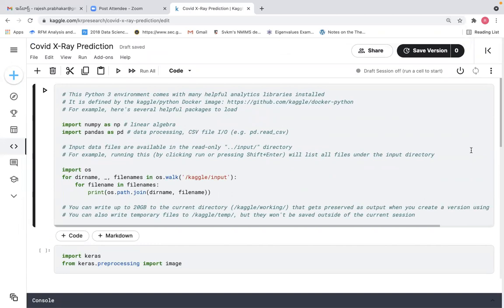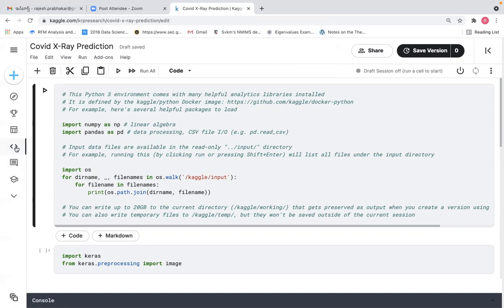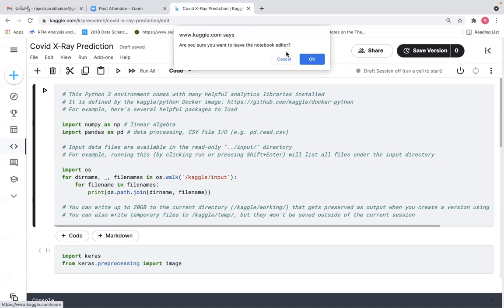Okay, all of you open the Kaggle. Can you guys confirm once you have opened Kaggle? Once you open Kaggle, log in with your email ID. There you will see something called code. Code, two arrows, this symbol will be there, the code symbol.